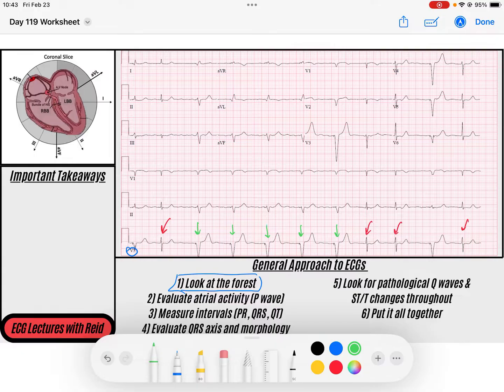And I notice at least, that when the narrow beats start, they always start a little earlier, right? If you look at the interval, it's a lot longer than the normal QRS to QRS interval. Excuse me, it's a little shorter, right? This interval right here is shorter than the wide to wide, right? This seems like these narrow beats occur a little earlier than we would expect based off of if we just look at this wide rhythm that's going.